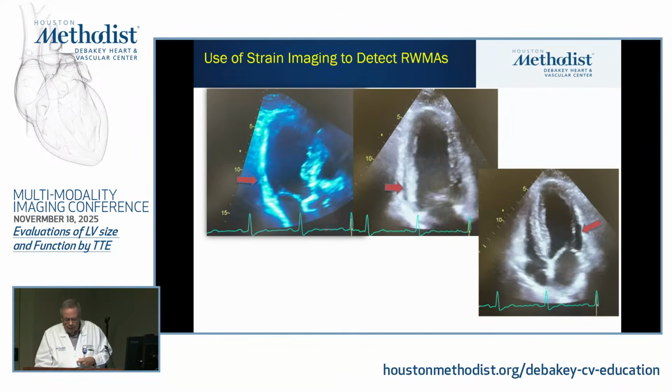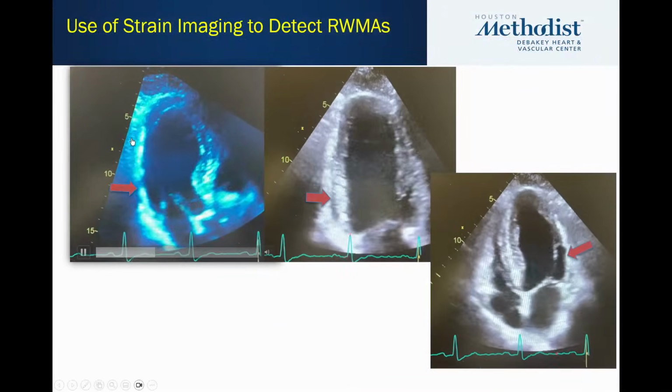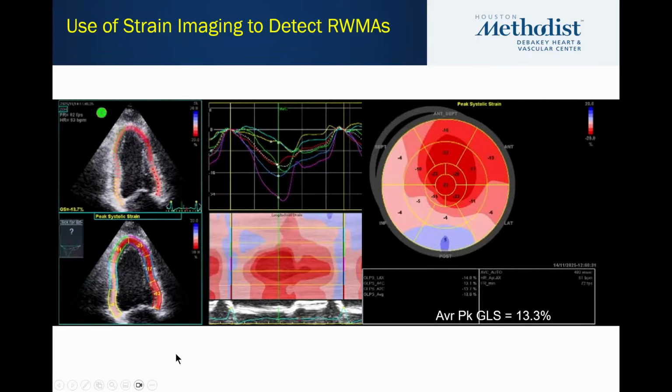So everybody in this room will recognize this, otherwise you are excused. A patient that has a big infarct, inferior wall, inferolateral wall, and even a little bit of lateral wall right here, okay? And the bullseye shows very nicely the areas that are preserved and big areas within that, either dominant right or dominant left, that are affected. In addition, you can see this curve here. This is end systole. After systole, there's a little further drop in the strain curve. Keep that in mind.